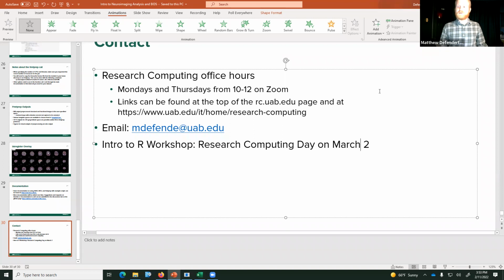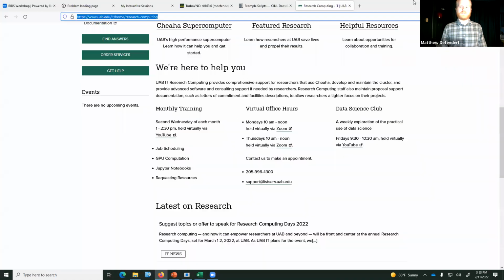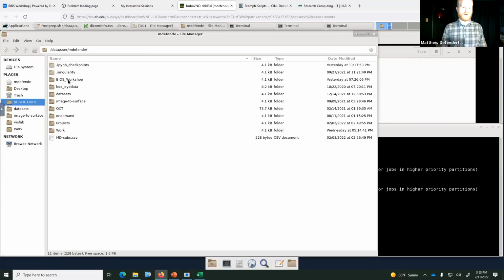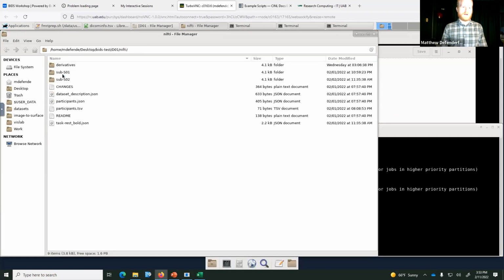So what is the directory for quality assessments of fMRI data at the end of the fMRIPrep process? Okay, yeah, so one of the things that's nice about fMRIPrep for people that are still here, if we go back into here, I've run fMRIPrep on this subject before. So I'm going to go back to that data set real quick. And in this one, I put the derivatives in the BIDS folder. It doesn't really matter, but it's fine.